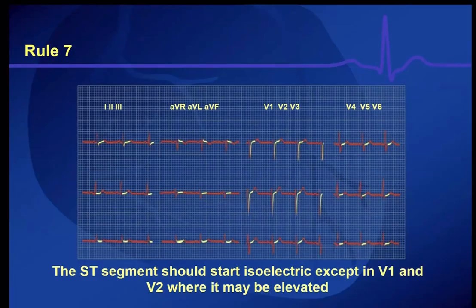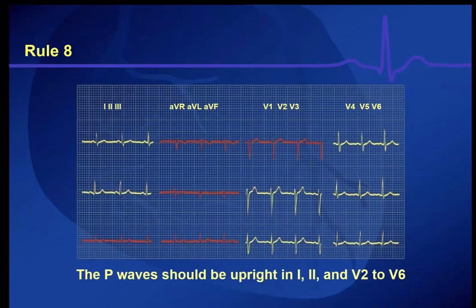We go to rule number 8, and rule number 8 speaks about the P wave. The P wave in almost all the leads should be dominantly upright. Apart from V1 and aVR, the P wave should be upright.